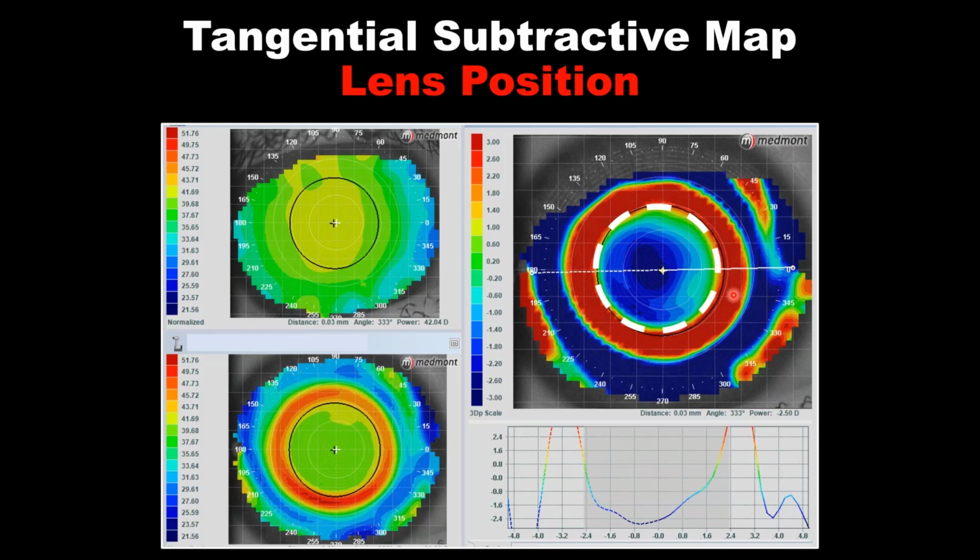Now look at the red ring. This is where your reservoir is, your suction force that's pulling on the epithelium. And surrounding that is the blue ring, which is where your lens aligns with the eye surface, where it touches down and creates some mechanical molding.